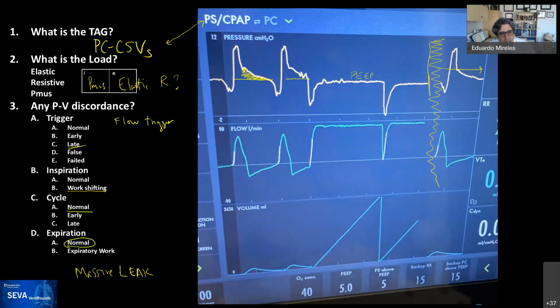But this over here, as Aman is pointing out, whenever we see this area now in our waveforms, that makes us think about the expiratory cassette or filter, or HME being clogged, and we've had several of those that have occurred. So if I just read this one, I would say there's a high amount of work of breathing during trigger. I'm not clear why that is. Maybe he needs more support, or there's an issue with resistive load. Based on what I'm seeing here, I would change that.